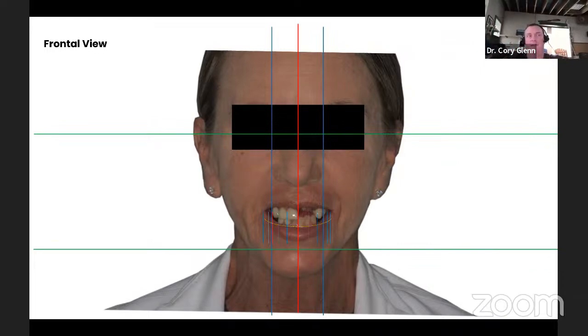So that's a really good way to do that. If you're trying to gauge exact tolerances between those, I guess you could use the measure tool, but you would probably be using something like SolidWorks, I would think, more of a CAD engineering program than a dental CAD program.